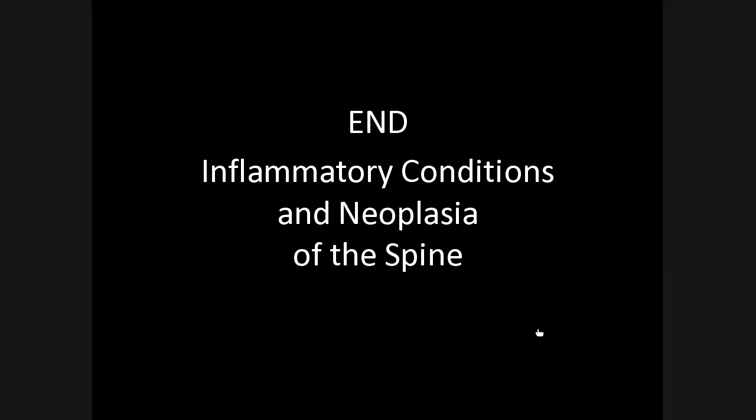Right, so that's the end of the inflammatory conditions and neoplasia of the spine, and that's the last of the spinal lectures.